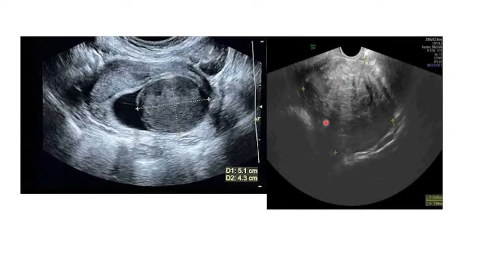So this one can also be focal posterior myometrial adenomyosis. Adenomyosis can also appear like that, and then this will be an adenomyoma instead of a fibroid. But because of the way it is well outlined like that, provisionally it looks more like a fibroid. So those are the things you have to be careful about when you're writing your reports. It's a fibroid, give also a differential of focal adenomyosis posteriorly.